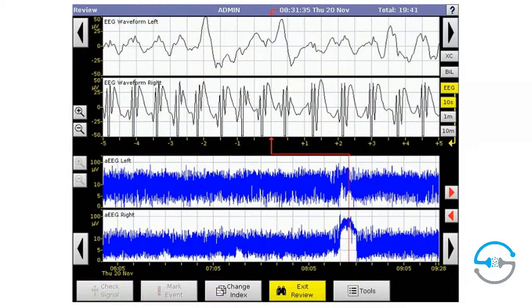So what we're looking for are the archway, so a kind of a rounded arch in there. And we want an archway, so this is a beginning, a middle, and an end, a crescendo, decrescendo of our aEEG band. And so I'll see that we're coming along, and all of a sudden we have this increase in voltage, remembering that the distance between the hash marks or the gray lines are 10 minutes, and that each single line of aEEG represents 15 seconds.